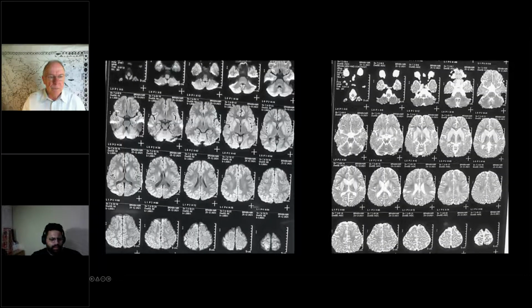Diffusion, there is some bright signal on the DWI, but they don't correspond with the low signal on the ADC. So there's a facilitated or a slightly mixed pattern of diffusion, but predominantly it is a slightly subacute stage or old stage, but edematous change in the dorsal striatum and some degree of volume loss in the cerebral and cerebellar hemispheres on both sides.